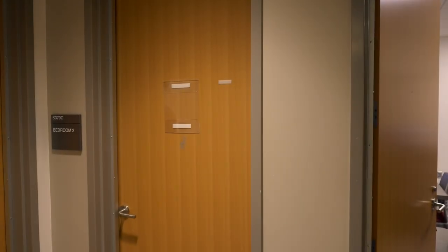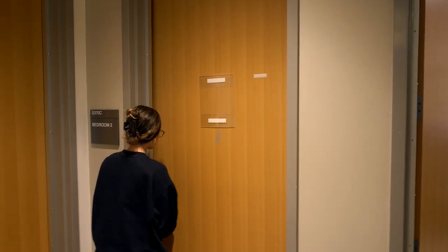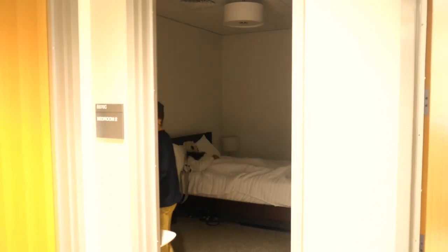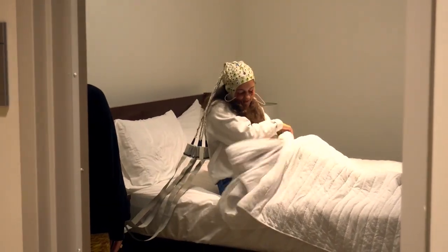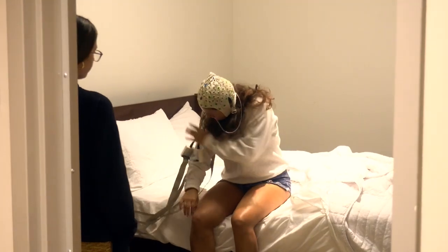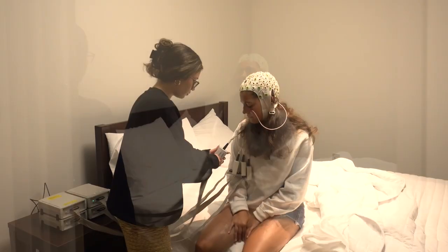How do we know someone is asleep? EEG can tell us. Beyond that, EEG can objectively capture changes in the brain that we can't see by just observing. We can use this data to understand basic processes like when people sleep and how different phases of sleep affect memory.